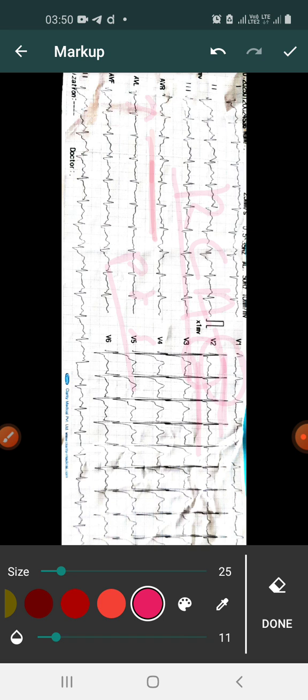So now we need to do the troponin. We did the trop T and it was positive, which is proof that it is a case of AMI. After that we need to take the posterior wall leads, that is V7 and V8. If we see that ST is elevated in V7 and V8, it is STEMI. And if we see that there is a depression in V7 and V8, that is NSTEMI.